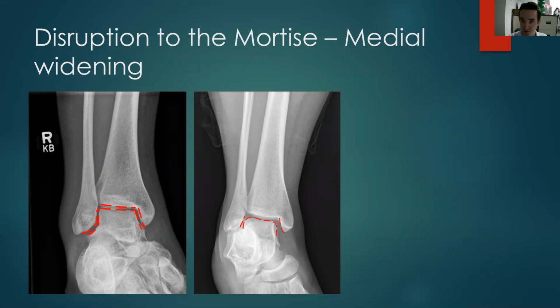Sometimes you'll have a small avulsion fracture fragment here. But the important thing to remember is that as part of your bony ring, we've lost one part of it, which is the ligament holding your medial malleolus to the rest of the medial joint there. But where's the other injury? We can't see it at the moment, but we should be looking to exclude it. Again, it could be your Maisonneuve fracture, especially as there's no other fracture to see at the lateral malleolus.